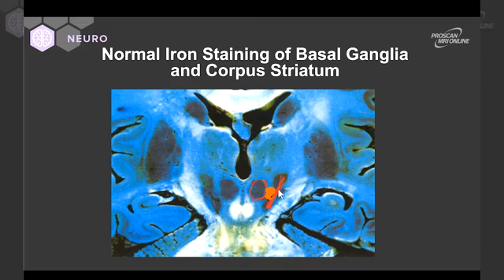We'll also talk about the medial lateral extent of accumulation of iron in the nigrostriatal distribution in the axial projection in the next vignette. Let's move on, shall we?